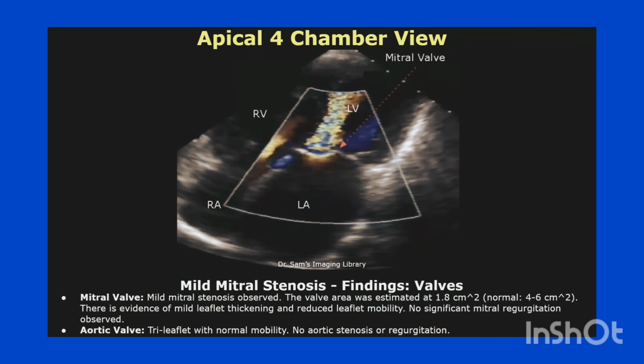No significant mitral regurgitation observed. The aortic valve is normal.